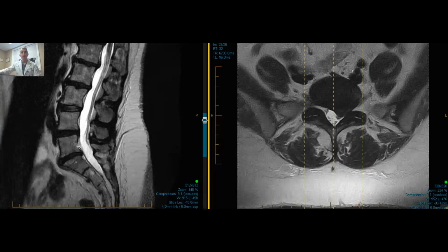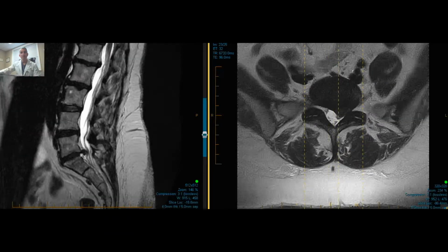But if we come down to this disc here, again, this square block's bone number 5, lumbar 5 or L5. Here's the disc. Here's the sacrum, which we often designate as an S. So this would be S1, 2, 3, etc. So the disc between bones L5, or lumbar 5, and S1, or sacrum number 1, as we call that, the L5-S1 disc. If I start panning this a little bit to the left, you'll see there's a big hunk of black that comes in here now.